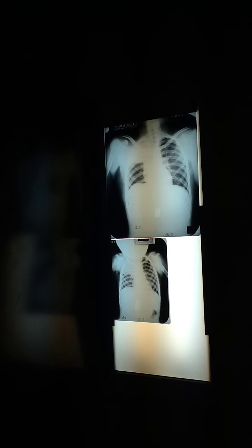It makes people very, very sick, and they go downhill very fast. Oftentimes they've been fighting an upper respiratory viral infection, but they go down very, very quickly. This is pneumococcal pneumonia, which is the most common acute bacterial pneumonia in humans. Great example also of airspace consolidation. Airspace consolidation. How many segments?